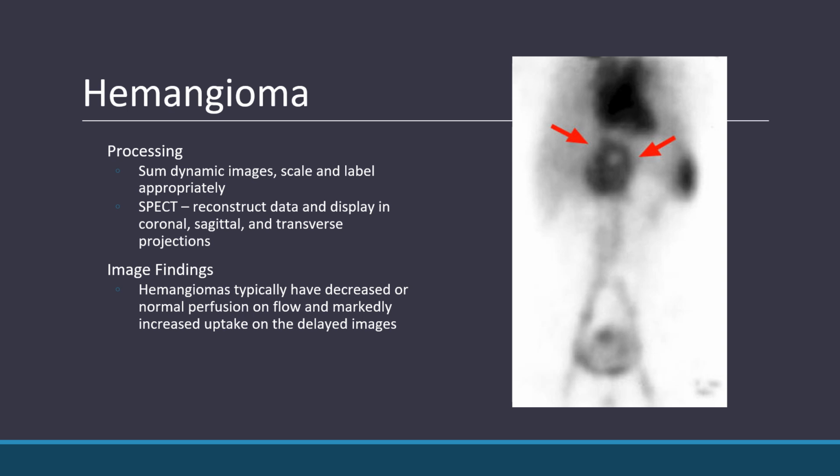But then as it starts to pool in the blood vessels, you'll start to see that there's a lot more increased uptake in the actual hemangioma compared to the rest of the liver.